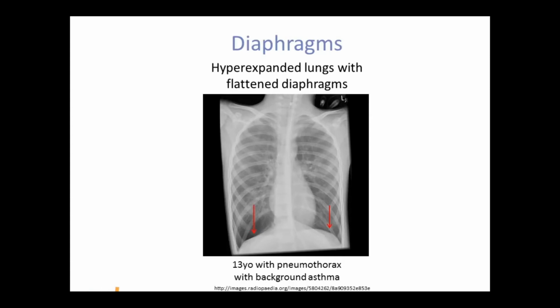Another feature that may be present in X-ray films of asthmatic patients is that of peribronchial cuffing, or thickening of the bronchial walls. You may be able to appreciate on our patient's film that the bronchial walls are more apparent than on a normal film. Let's take a further look at other pathologies that may affect the diaphragm. When examining the diaphragm, first look to see if both sides are equal, though the right hemidiaphragm may be slightly higher than the left due to the presence of the liver.